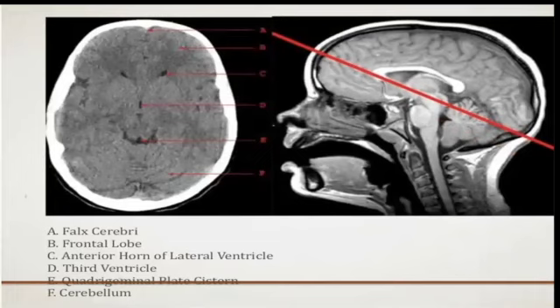So again, still going up. Now at this point, A here is pointing towards this whitish triangular part. It's a very small triangle here, which is the falx cerebri. Now, the falx cerebri is in fact a very large crescent shaped fold of the dura. Normally it should descend in the longitudinal fissure between the cerebral hemispheres. It should separate the two hemispheres and support the dural sinuses. But here, because we're looking from an axial point of view, it should only appear to us as this small triangular part.